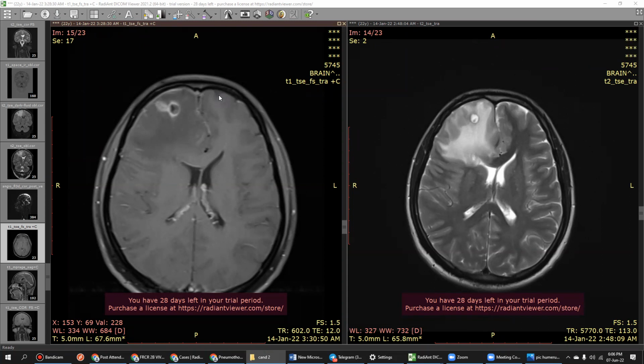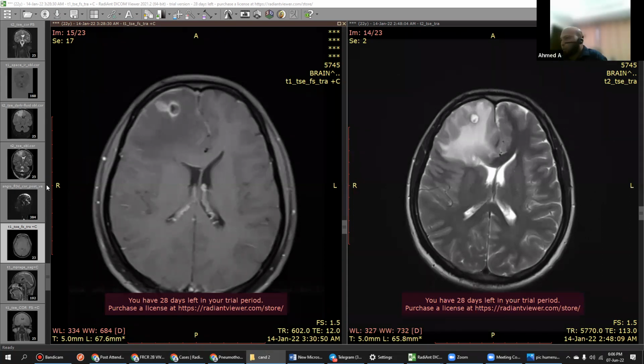So ascending aorta was not involved in that case. Ascending aorta, the part of it was involved. You can see. Aortic arch and part of aortic arch and the part of the ascending aorta was involved. Yes. Right. Okay. And I know this case because this patient, if interesting, I'll just show you. Anyhow, you have like 1 minute extra. So where is that? Okay. It is already open. No, I closed it.